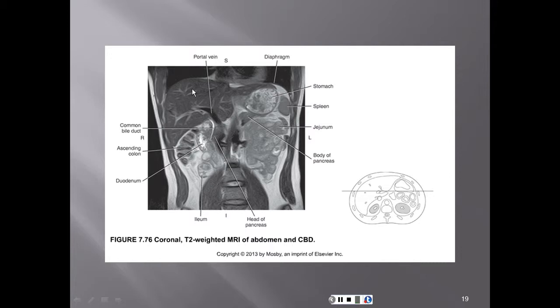It's clearly depicted. We have the liver, we have the stomach over there, and we have the small bowel. We have large bowel right there. Vertebral disc, and right alongside of the vertebra is the psoas muscle. We have the dome of the diaphragm right there, and the most inferior aspect of the heart.